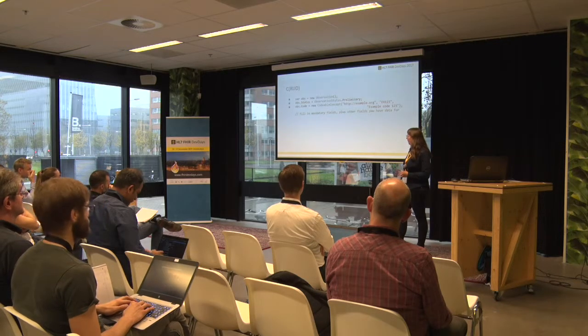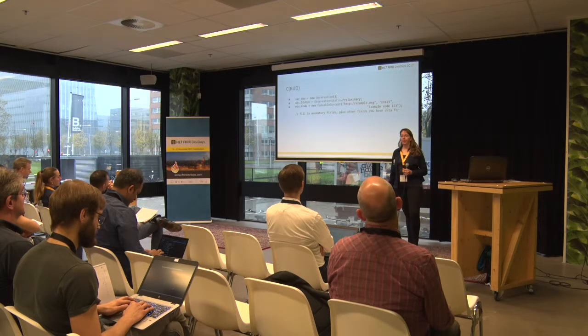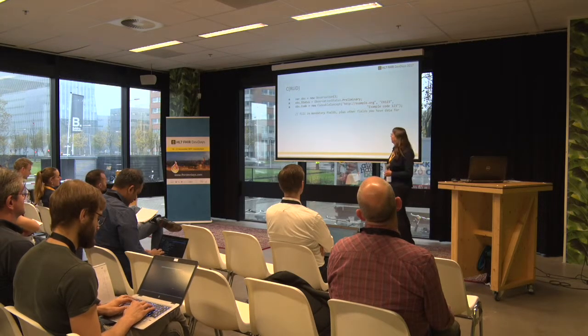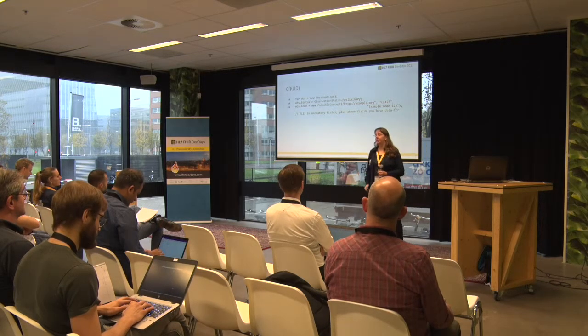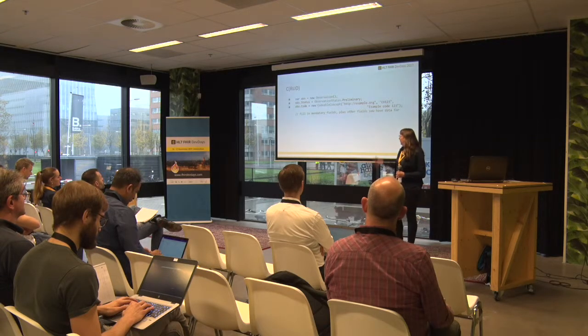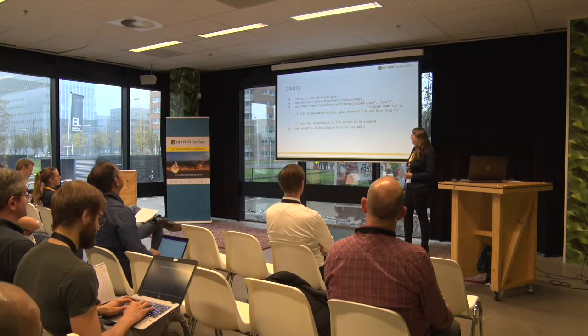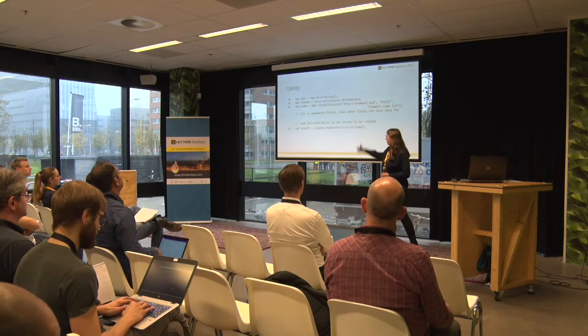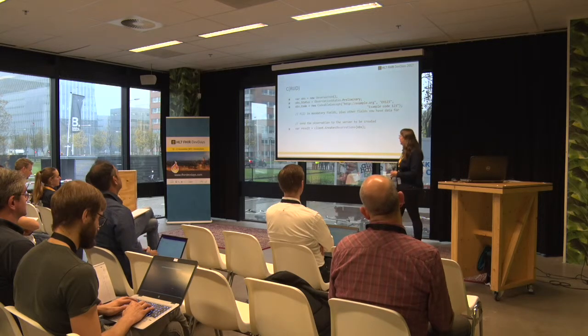The client can then be used to perform CRUD operations. So in this case, the example is for the create operation. I've created a new observation from the earlier parts in my presentation, and then I can fill in other mandatory fields and fields you have data for. And then I want to send this observation to one of the test servers. So it's just a matter of using the create method to send your observation to the server.